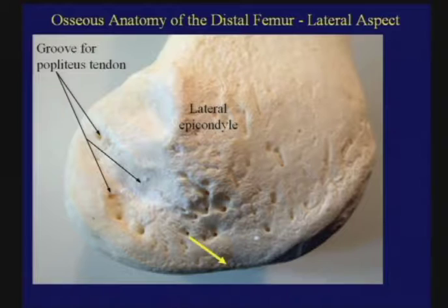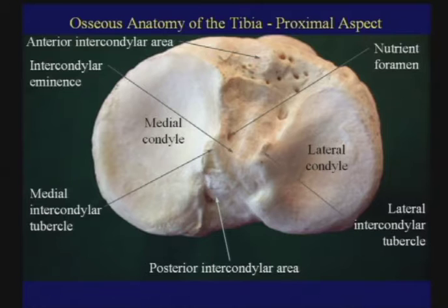We're going to learn about it, obviously, tomorrow when we talk about deepening of this notch in cases of anterior cruciate ligament tears. But this allows you on radiographs and certainly on MR to separate the medial condyle from the lateral condyle based upon the location and prominence of the flattened areas. Finally, on this image, you can see the groove through which the popliteus tendon passes. This can be very, very prominent and sometimes actually look like a lesion.